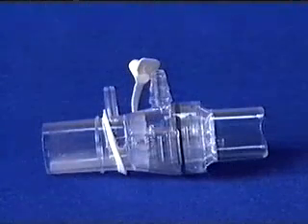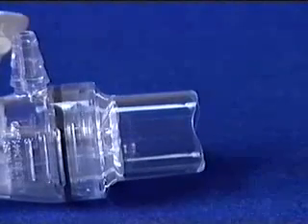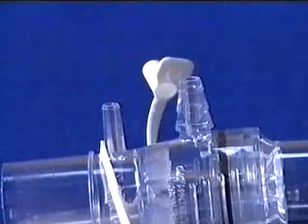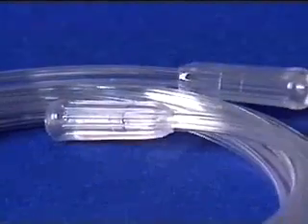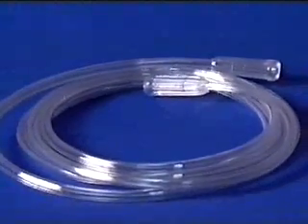The EzPAP system consists of the following items: the positive airway pressure device, including an ambient air inlet with a 22 millimeter serrated connection, a gas inlet port, and a pressure monitoring port with cap. The patient interface, a mouthpiece or mask, and a 7-foot length of oxygen tubing to connect the gas inlet port to the wall flow meter.